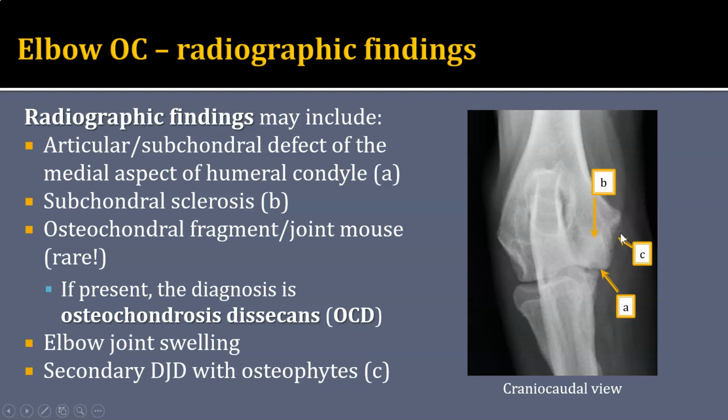This patient has very mild degenerative joint disease secondary to the osteochondrosis, and the mild nature is really this irregularity that is some early osteophytes forming on this medial epicondyle. The medial side is most common to find the degenerative changes because the lesion is medial. And then sometimes we'll see some osteophytes on the proximal ulna here near that medial coronoid process.